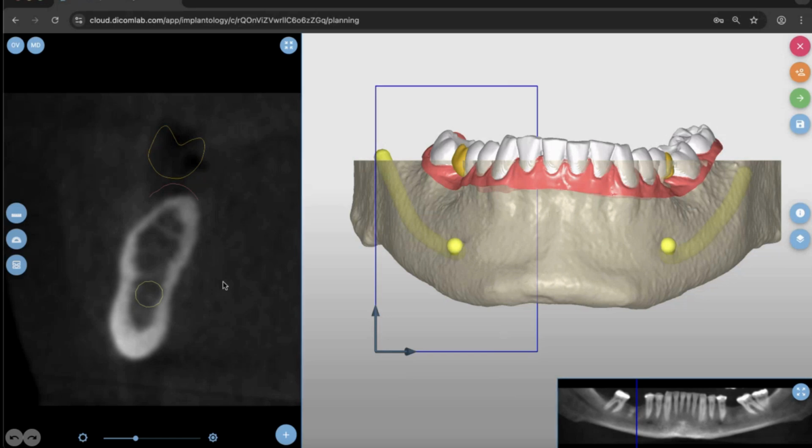They are quality checking it, they are registering it, they are coloring it and drawing it up in this way. They are also setting the right planes and the planning arch for you. So it really gives you an ease of user experience, since you upload raw images to our system, and this is how you open it up, completely ready for treatment planning.